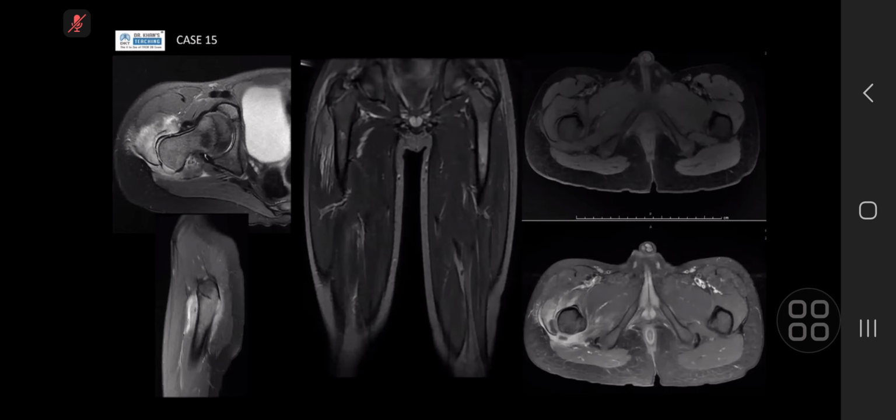Okay, thank you. So, and this is osteomyelitis. So you've got soft tissue edema. You've got this periosteal elevation. And yes, so this is a T2 fat suppressed, and you can see marrow edema as well here between the greater trochanter and the epiphysis, the metaphysis. And this is apophysis, which is similar to epiphysis, just that it doesn't add to the lengthening of the bones. Okay, so this is apophysis, and this would be the metaphysis, as you normally know in your long bones. Soft tissue edema, that shows you again on a coronal.